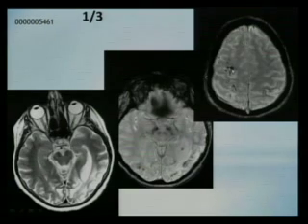This is a patient with old blood here and here, these little dark areas. And something old is going on here because the ventricle on this side, on the same side, is dilated. On the other side, it's tight. So here it has to fill in for some loss of volume.